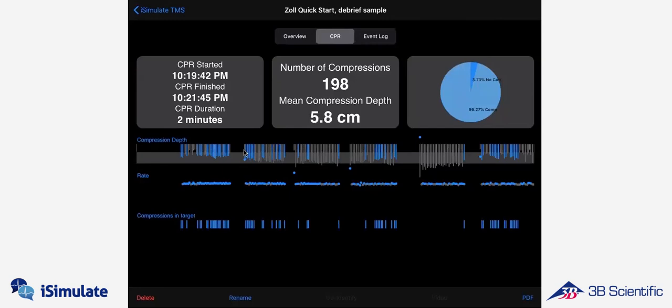So you can see, for example, maybe they're getting tired at the end of their 2-minute cycle and it's drifting in a downward fashion towards low quality. Maybe they don't start out well, or maybe they're variable all over the place. It gives you specific feedback on each 2-minute cycle so you can help evaluate. Maybe you know student A who did this one, and they have a consistent pattern you want to talk about, whereas B is a little over-aggressive as they get farther into it. Here's your compression target rate down at the bottom, and you have, again, an ability to give feedback in terms of the quality of their CPR.